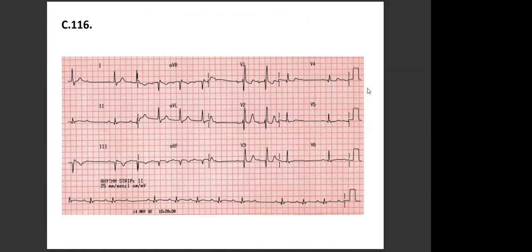Okay. And heart axis. Lead 1 is positive and AVF is also positive. So no, AVF is negative. Look at here. AVF is here. AVF is negative. Lead 1 is positive, AVF negative. So this is not normal. This is left axis deviation because lead number 2 is positive. So this is between 0 and -30. Okay, go on.